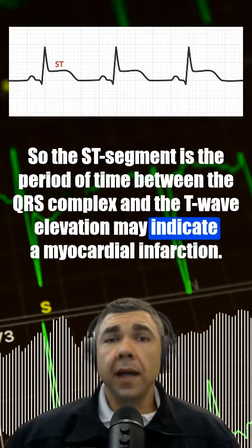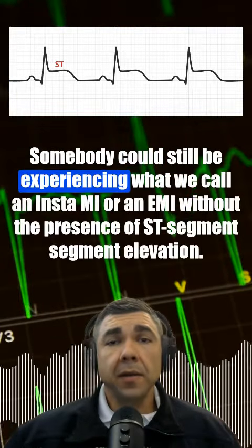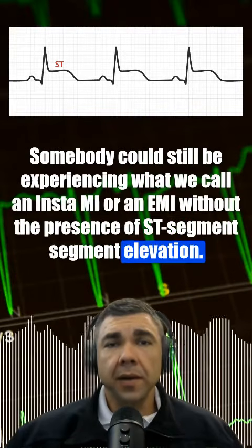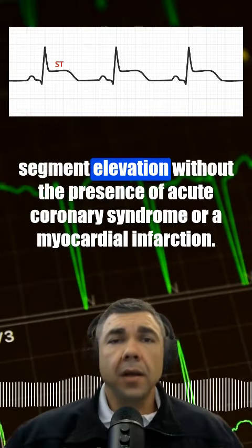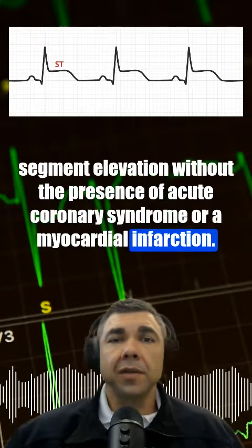So, the ST segment is the period of time between the QRS complex and the T wave. Elevation may indicate a myocardial infarction. We call that a STEMI. Somebody could still be experiencing what we call an NSTEMI or an MI without the presence of ST segment elevation. And somebody could have ST segment elevation without the presence of acute coronary syndrome or a myocardial infarction. That's all.